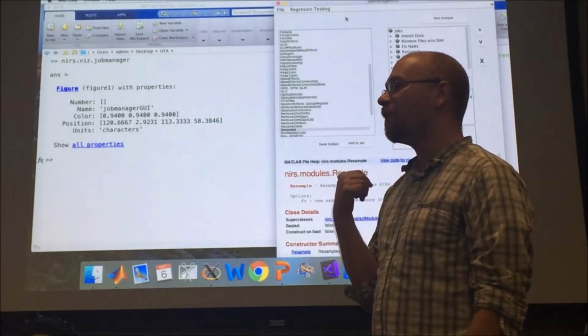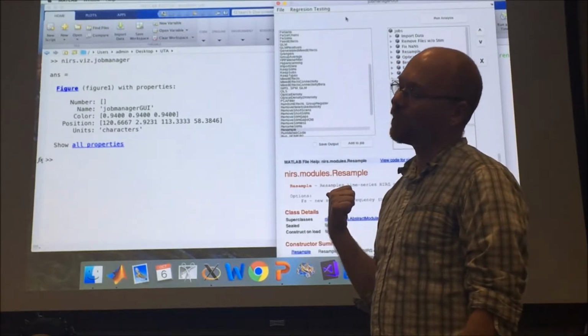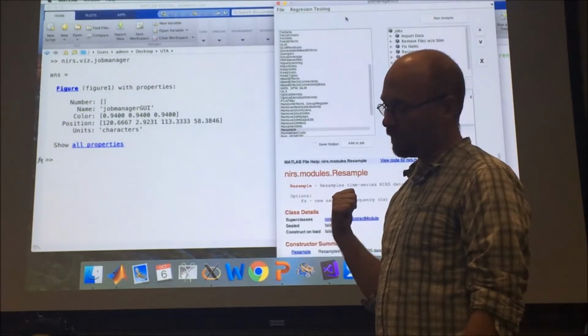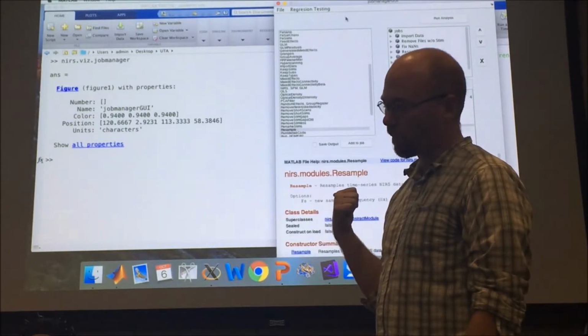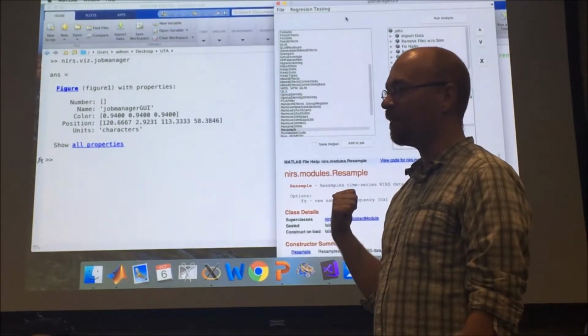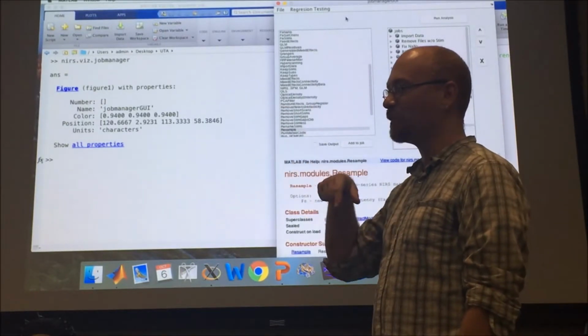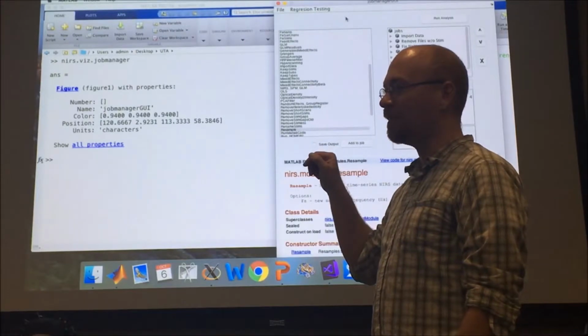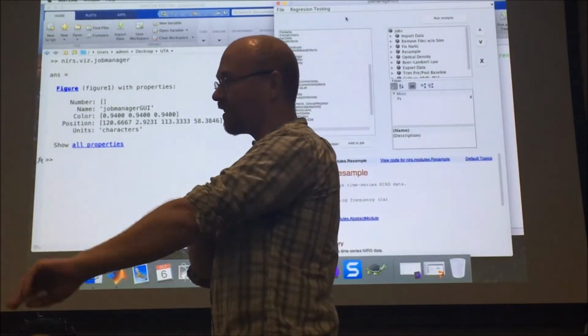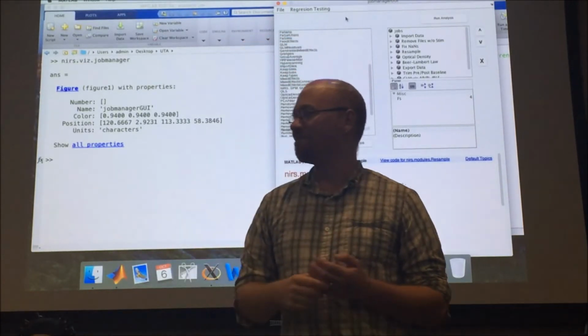Yeah. This is a brand new feature that I added like last week in my toolbox, which I'm really proud of. It outputs to, I forget what the format's called, but it's a self-contained 3D OpenGL object that you can drag around and spin without anything, and you can embed it in PowerPoint, so you can have moving brains in your PowerPoint lectures. So, yeah.